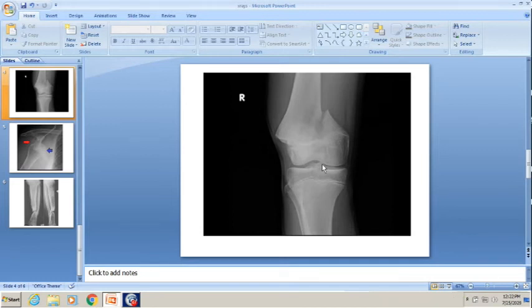There is a classification for epiphyseal fracture. Salter-Harris classification. So which type? Salter-Harris. So which do you think there is a fracture? When the fracture line extends above to the metaphysis, type 2 Salter-Harris. Okay, so this is type 2 Salter-Harris.